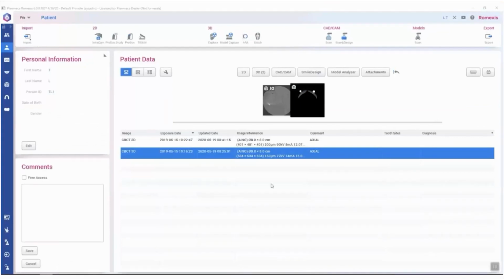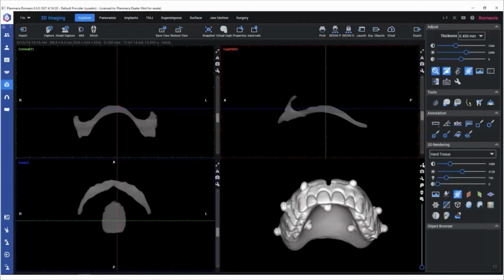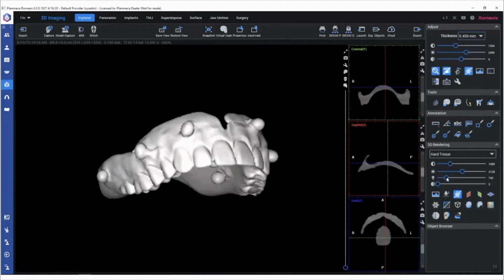Let me quickly show you this workflow. So what do we have? We have two CT scans. And Sila, sorry, I think I'm taking a little bit longer. I'll probably run over a minute or two, but there are a couple of things I do want to share.